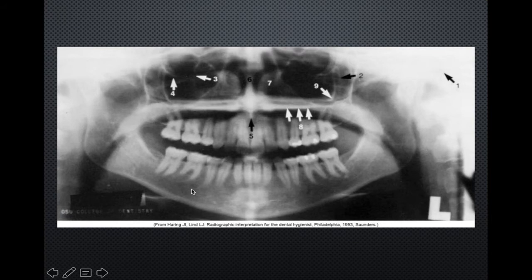And that's normal. Sometimes that will happen on a panoramic, that you'll see something easier on one side than you will on the other, which is why we say that panoramics are not always a good substitution for a full mouth series. On a full mouth series, we would definitely be able to see the mental foramen bilaterally. We would definitely be able to see more specific anatomical landmarks.